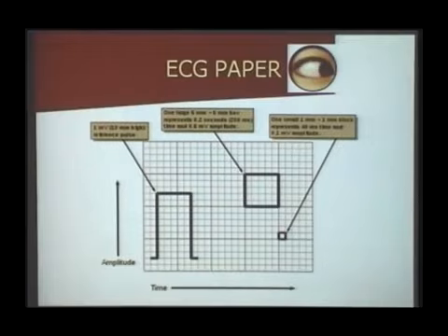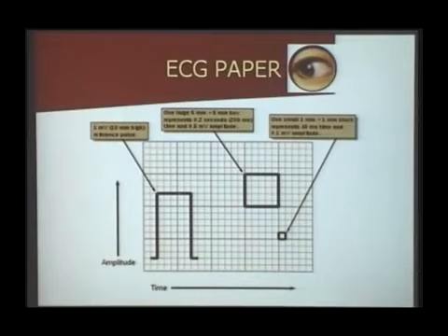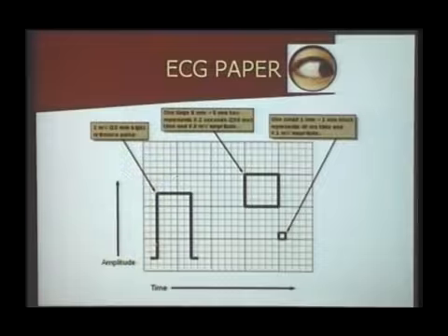So, in any ECG, before you interpret it, you have to look at this vertical bar which is being recorded. In many ECG machines, it may be recorded before each one of these leads, or they can give it at the bottom of the ECG paper or on the side of the ECG paper and say in which standardization they are recording and which speed they are recording. Without making sure of this standardization and speed, you are not supposed to interpret an ECG. Very, very important.